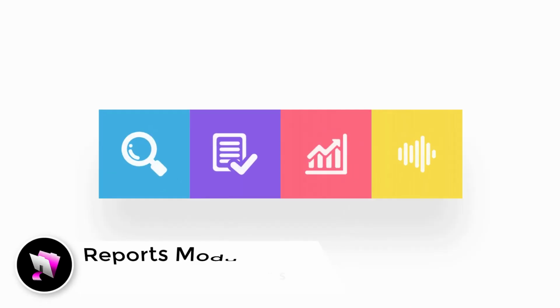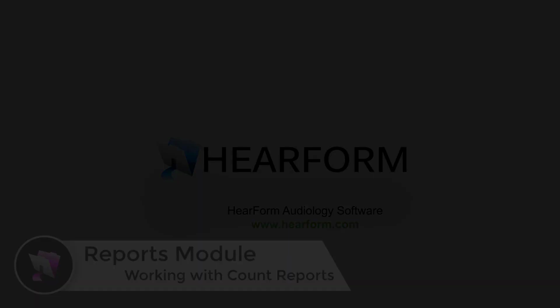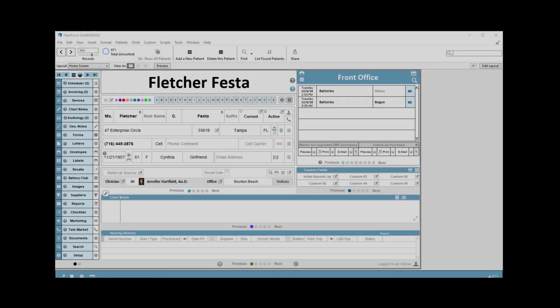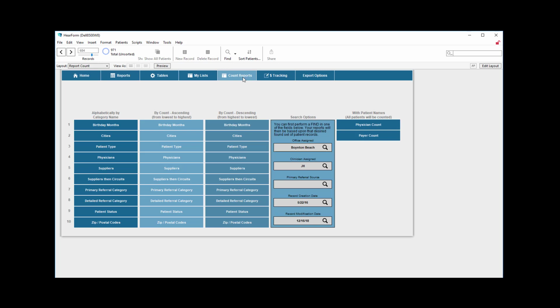Welcome back. This video will explain how to work with the Count Reports module in HearForm Pro. Here's how you navigate to the Count Reports area. We're going to click the button here called Reports, and then up here the Count Reports button.